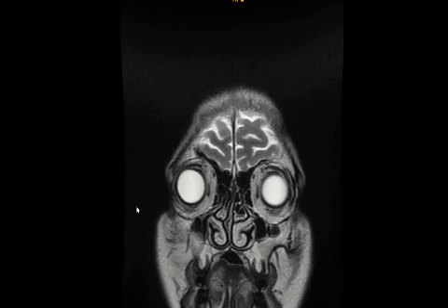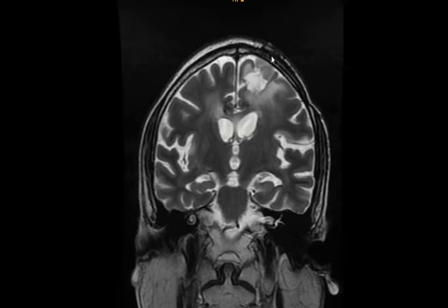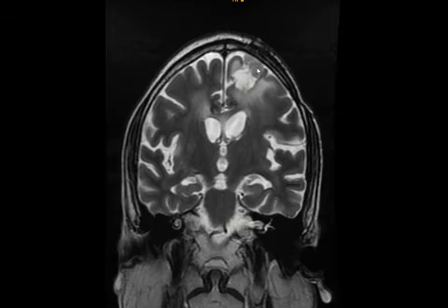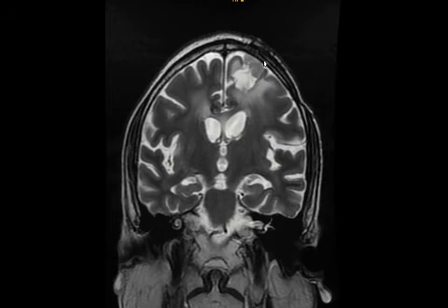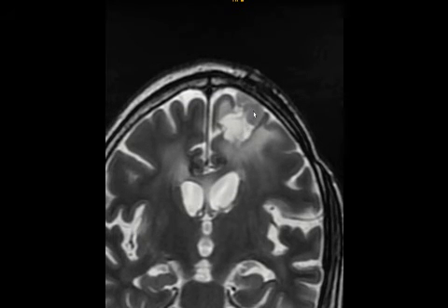And then finally, I will show you the T2 coronal images. You can see right here, which wasn't present on the previous scan, this gyral thickening. If you look at that previous scan, you can still correlate them, and you can understand that there was a very small lesion here, which was showing a bit of restriction of diffusion, and we were not sure to call it that or not.